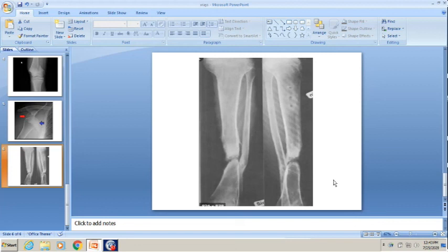So these are some of the X-rays from each topic. It is basically so that you become more familiar with how the X-rays will come. Usually in table 5 you will have around 20 to 30 X-rays, and you will be asked a few of them by the examiner.